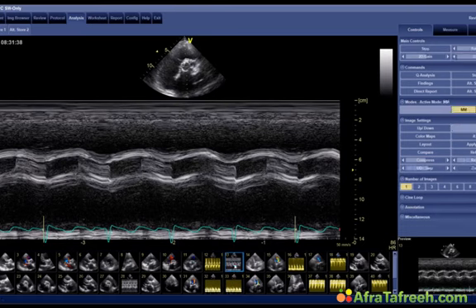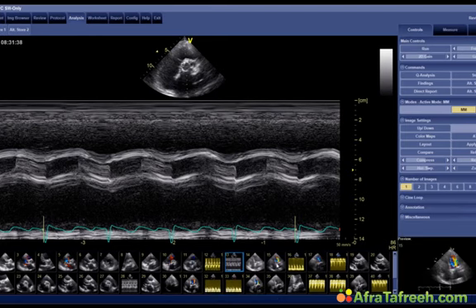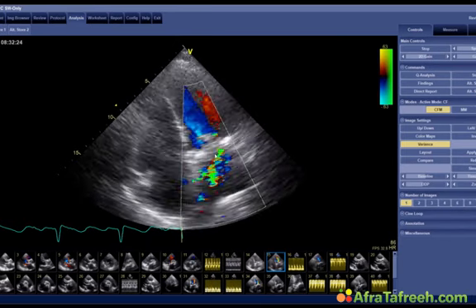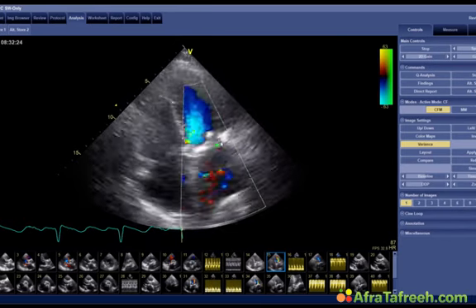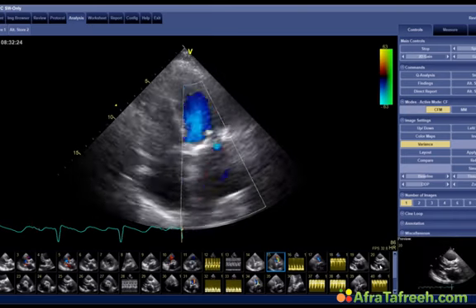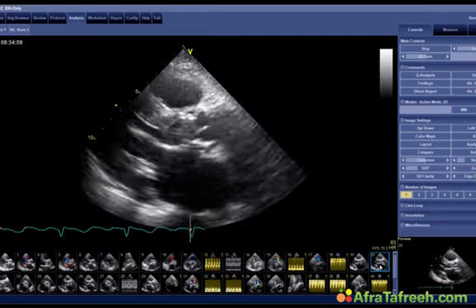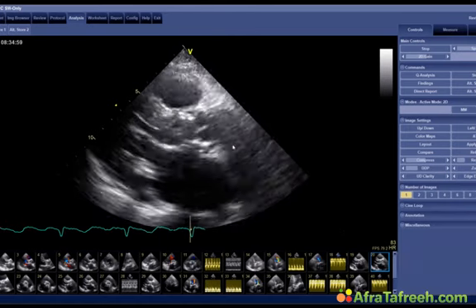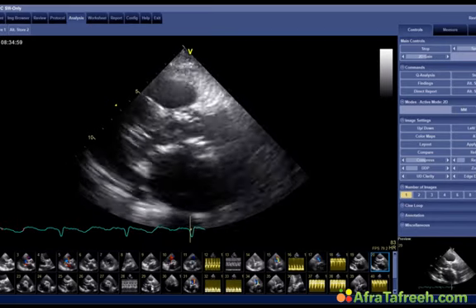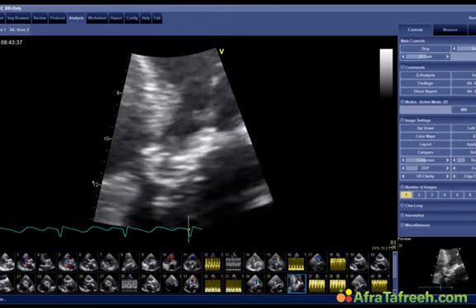Okay, this is the M mode across the aortic valve. She also has significant mitral annular calcification. By the way, if you compare it with the previous study, you can see that there's actually a progression of mitral valve annular calcification, but this is not really what I wanted to show you. I want to make a different point. But before I do that, I want you to judge the aortic valve and see if anything is abnormal or not.